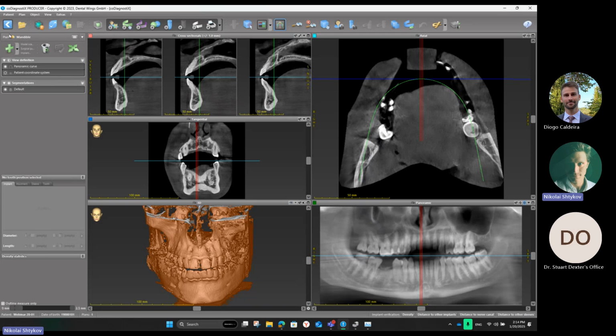And here in the upper part, you can see the AI assistant icon. When you see the orange hourglass, that means the AI assistant started working. If you have this icon without any sign, that means that the AI assistant hasn't started. You haven't started it for this case, and you can just click on this, and your AI assistant will start working. When this icon turns green with the check mark, that means that the AI assistant finished its work.